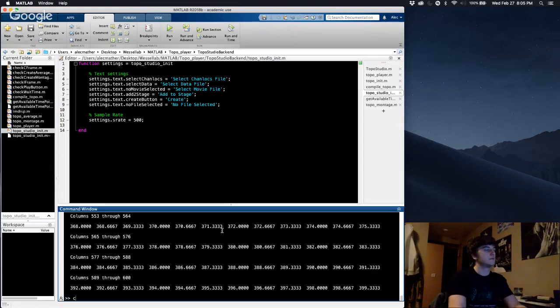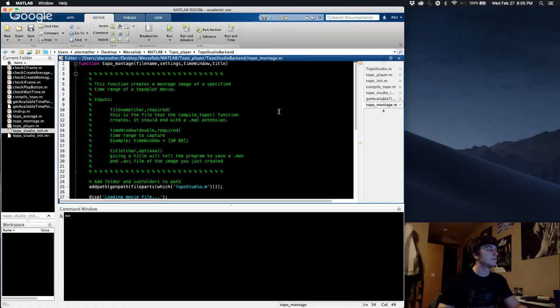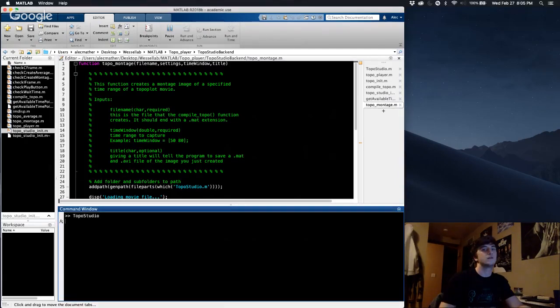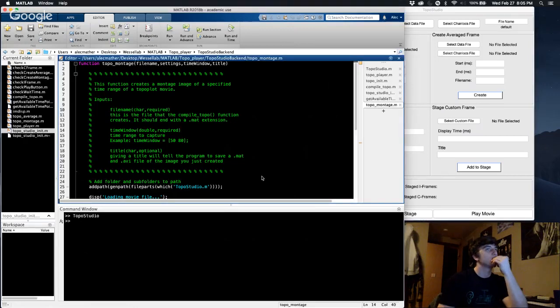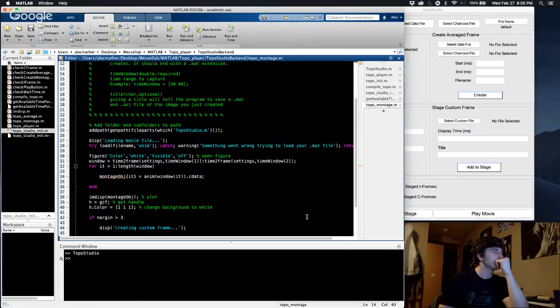Let's clear all this out. Studio. Whoa. And let's keyboard into our montage creator.